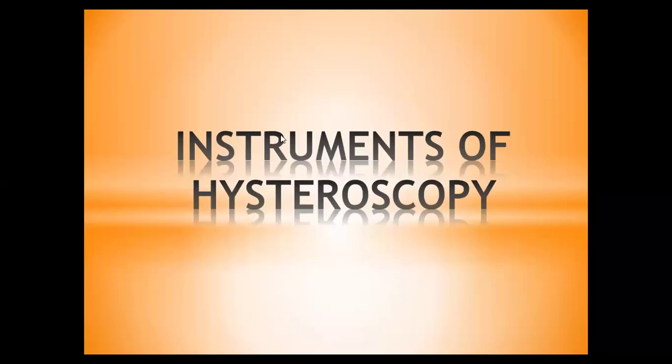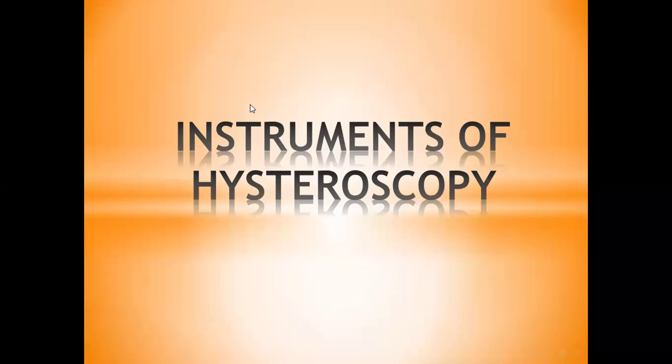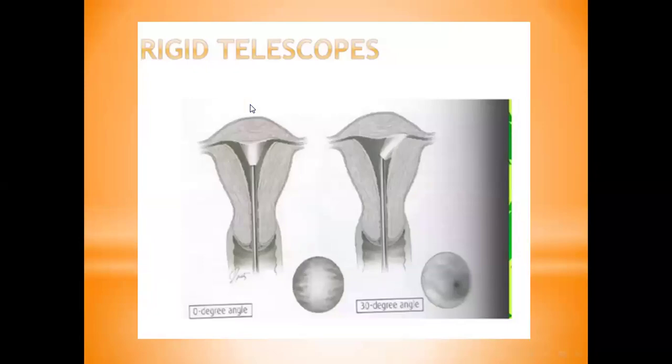We speak today about the first lecture of hysteroscopy, the basics of hysteroscopy, to know what the instruments of hysteroscopy are. First is the telescope, and most of the telescopes used in hysteroscopy nowadays are rigid hysteroscopes. Like this, the hysteroscope means العدسة in Arabic.